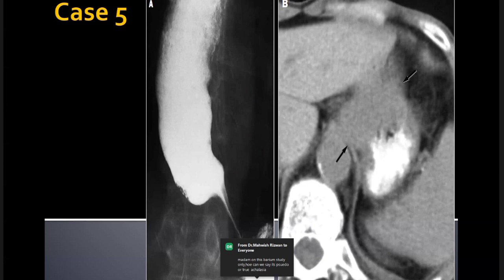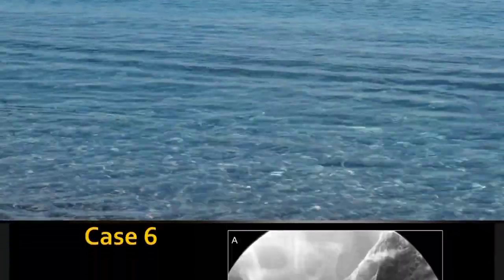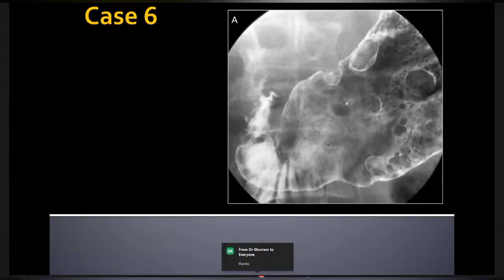Yes, ma'am. This is the spot image of the double contrast barium meal provided to me at the level of the stomach, in which I can see multiple filling defects. These are seen within the gastric lumen, and also there is inward drawing of the barium column along the lesser curvature at the mid zone.